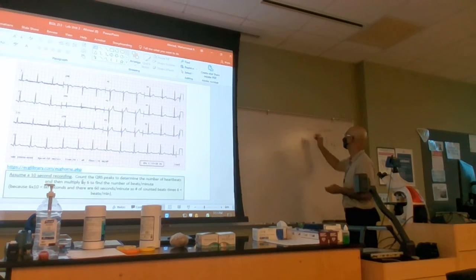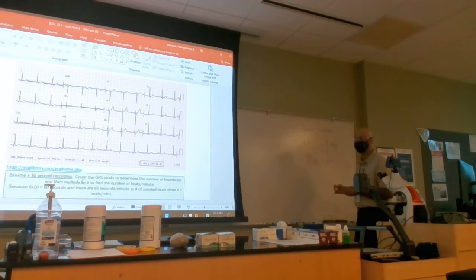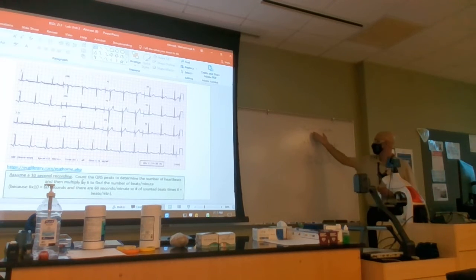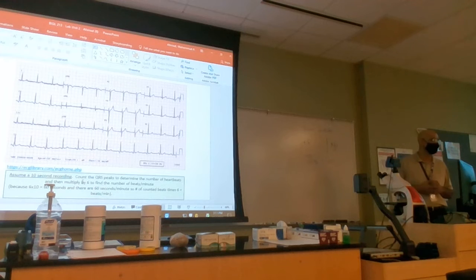You said 12? Who said 72? Good job. It is 72 beats per minute. Yes, guys, it's 72 beats per minute. You simply multiply this 12 by 6, right? You got 72 beats per minute.